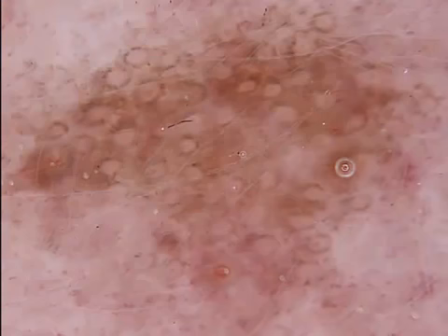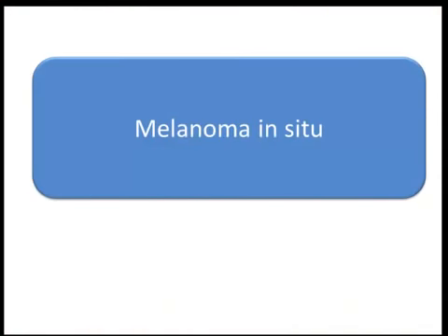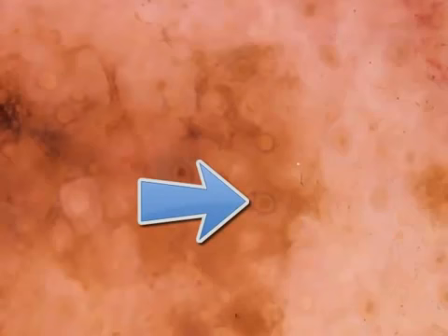Now here dermatoscopically you see circles, mainly gray circles, which means there's a lot of pigment within the follicular epithelium, and this indicates usually, if there is only a pattern of circles, early lentigo maligna. Melanoma in situ. Another case here, clinically, a pigmented macule. Dermatoscopically you see a structureless pattern, but you also see here circles, which means gray circles, some brown circles, and some semicircles, which are called asymmetric follicular openings. And here also some circles, and these circles are a good clue to lentigo maligna.